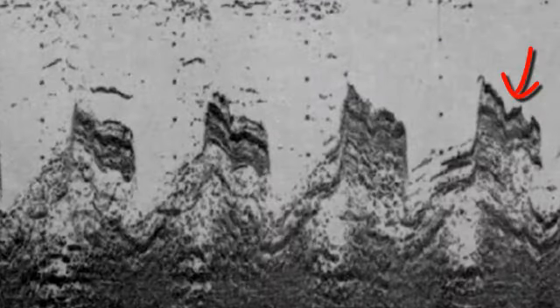Mitral valve with ruptured chordae and vegetation. Look at the erratic, chaotic movement of the ruptured chordae. It's a gross movement, different from the fine, sharp movement of the torn paper, also seen in the enlarged view. Notice that there are no lines inside the smudge.